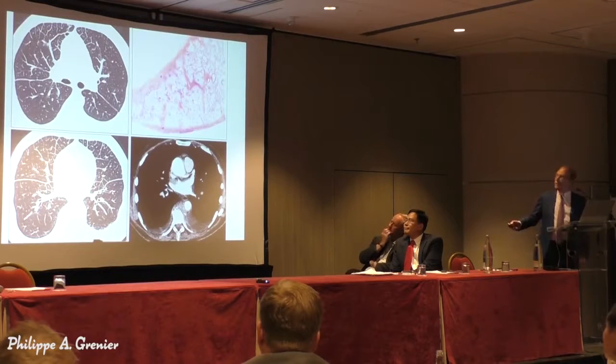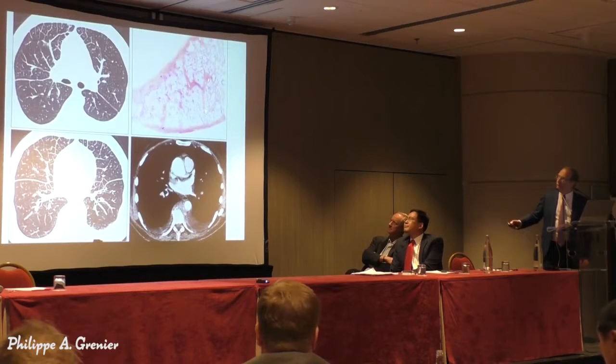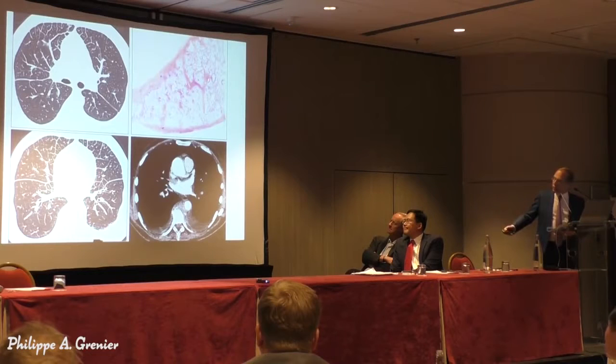On the lung biopsy, we see this infiltration of the interstitium along the pleura. And we see the thickening is extending into the interlobular septa here and here. In addition, in this patient, as often, there is associated pleural effusion and thickening of the pleura here, in association with local, focal infiltration of the mediastinum in this patient.